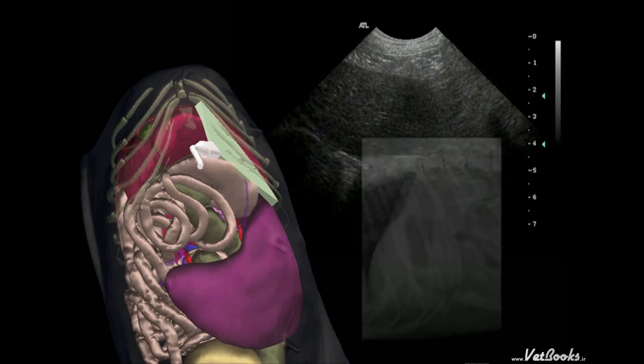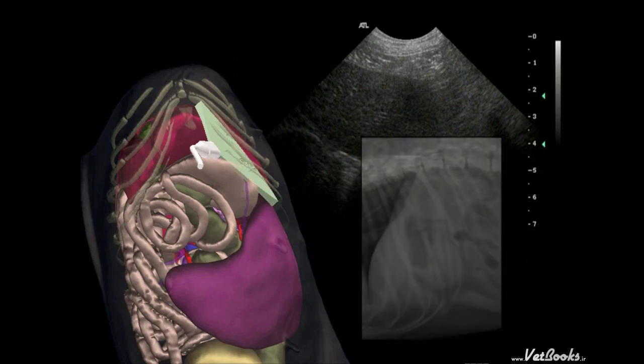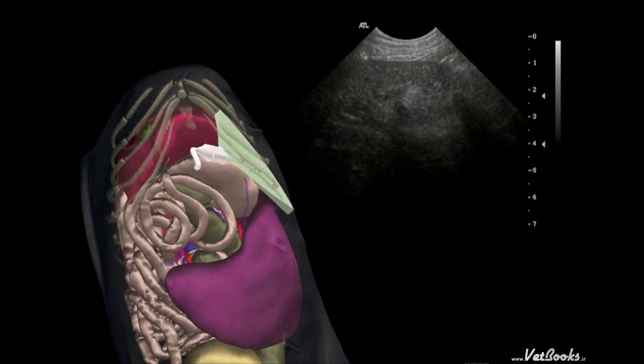Just like you would do with a lateral radiograph, in most dogs and cats, the liver extends as far as the end of the costal arch, but in deep-chested dogs, it's often located more cranially, and in some small dogs and puppies it may extend more caudally.